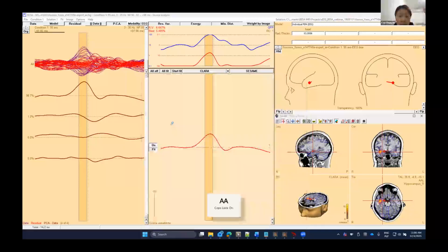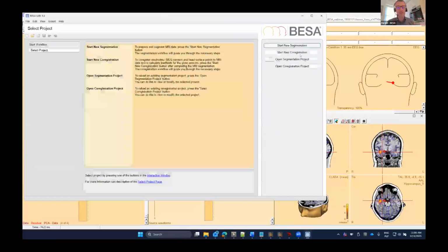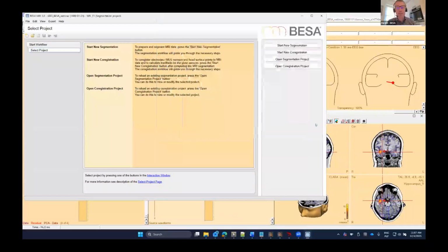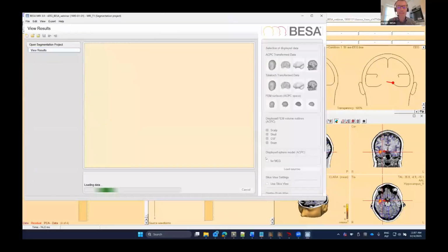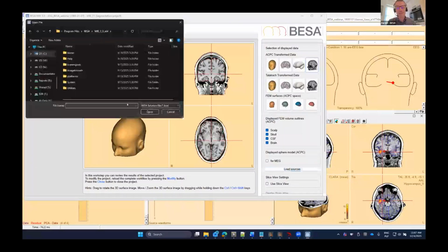So I can save several dipoles together. You mean that? Yes. But if you have several separate solutions, you need to first combine them with append solution. Maybe if you write a quick message to our support portal, we can help you with more details.